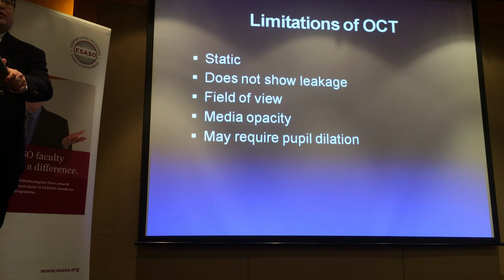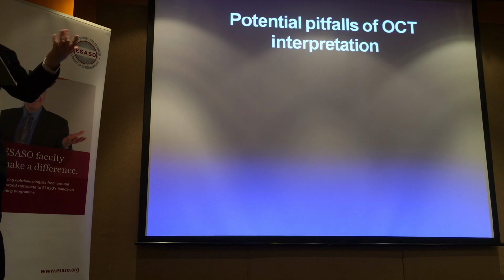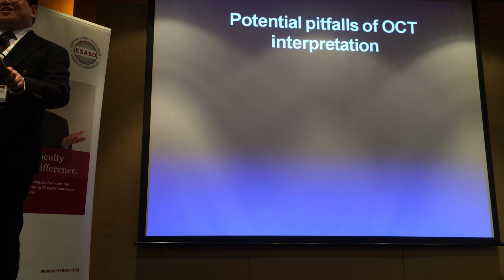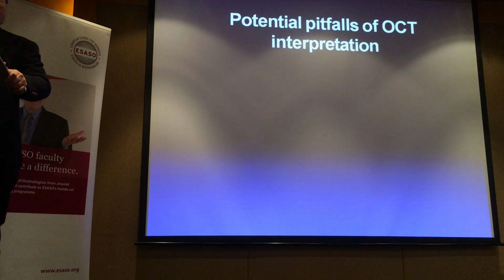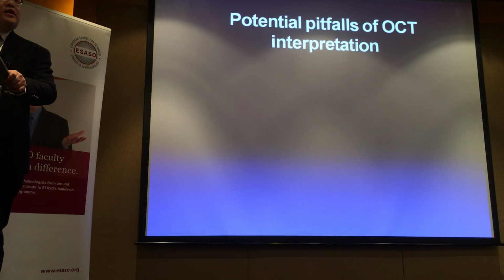So let's go through some examples, and perhaps in some cases I would like a bit of interaction as well from this, to tell me what you think could be done better for some of these. But so here are some pitfalls of OCT interpretation.